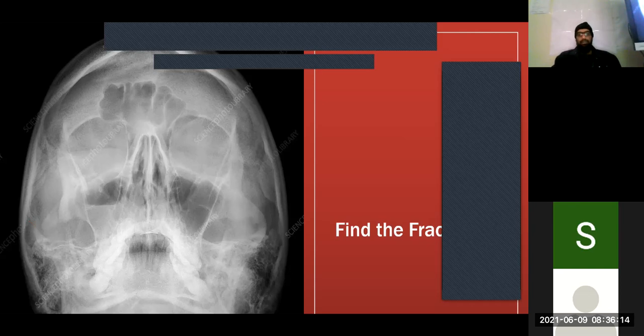Okay, so this time if you follow line number 3, the one thing we'll notice, it seems okay. All right, the injuries generally will be seen around there. There's one other thing to notice. Compare the two sinuses to one another. Do they look the same? No. Which one looks different? This one, isn't it? What's happening over there? What's this?